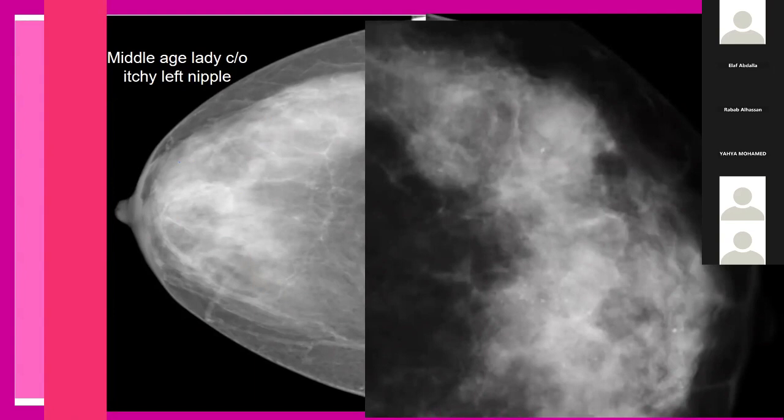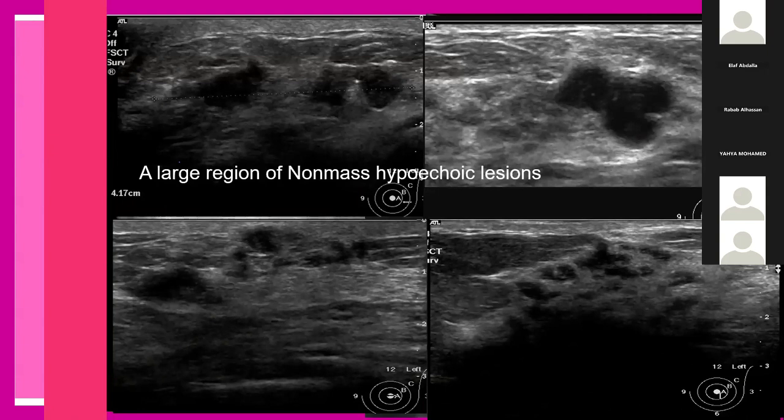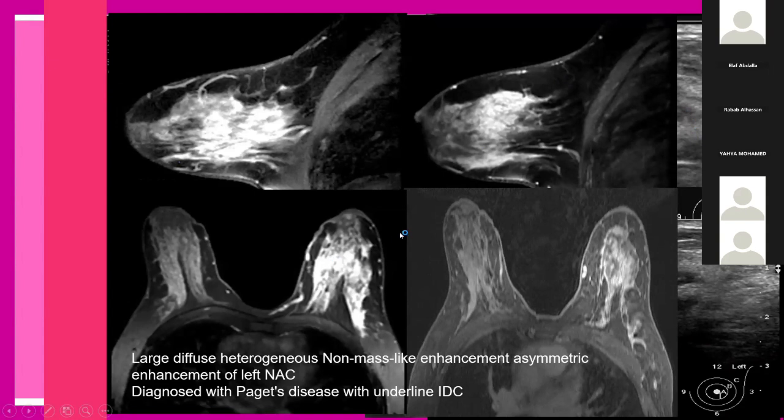Can you see here, even associated with diffuse multi-grouped pleomorphic calcifications? And here we can see the companion ultrasound demonstrating these non-mass ductal-like infiltrative lesions throughout the parenchyma and a malignant intramammary lymph node. Proceeding to MRI, it demonstrates frank diffuse enhancement, asymmetric to the contralateral breast, which is even a little bit enlarged, and these are clumped; although it is diffuse, it is clumped.